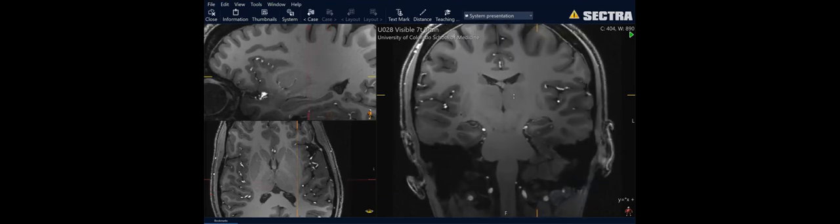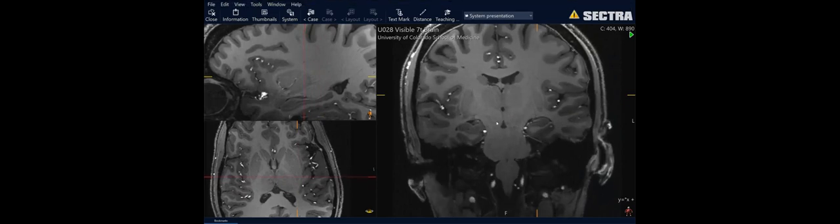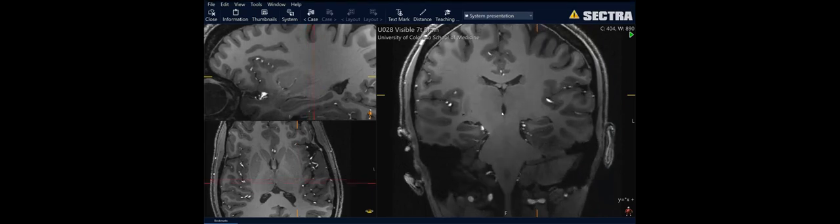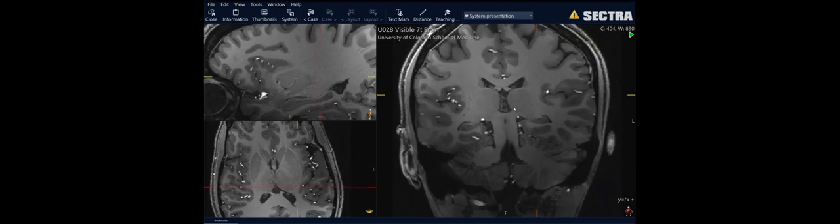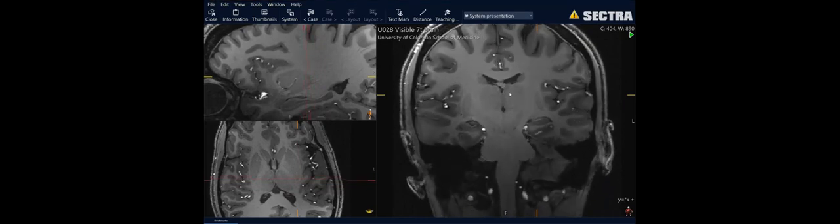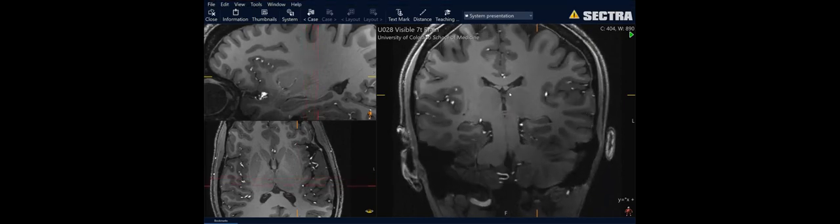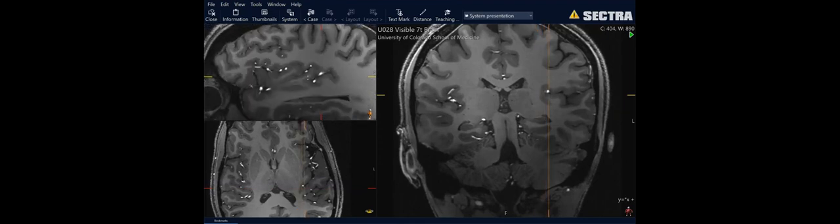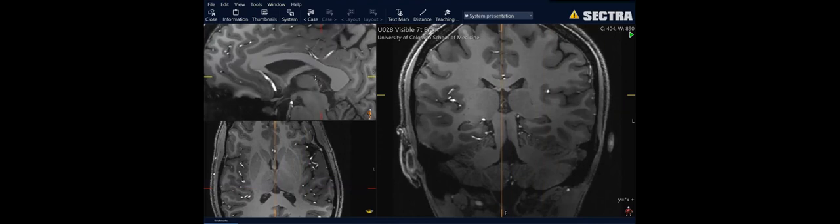Okay, let's circle back again. Starting with the thalamus again, substantia nigra, third ventricle, and what we have, can we make them out? Not quite. I was seeing if we could make out the pineal and suprapineal recesses on the coronal.